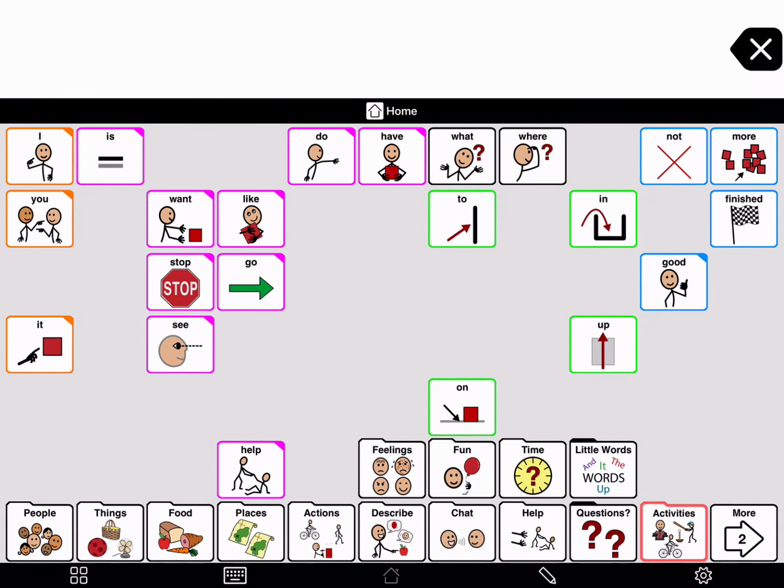Sometimes you may wish to use the hidden buttons. Perhaps you are playing bubbles and modelling up. And you also wish to model down, but down is hidden in this step. To temporarily show hidden buttons, you use the Explore function.